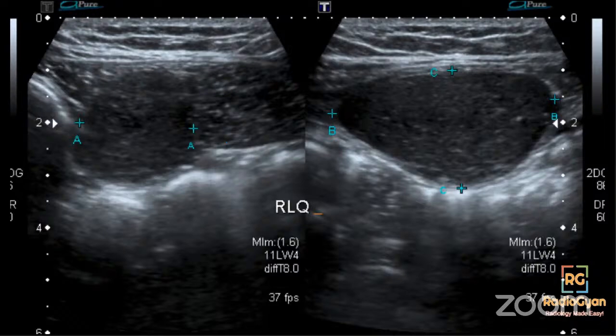I have an MR image to follow, so I think that would be more helpful. But just on the ultrasound, what does this appearance make you think of? What differentials would you think of?